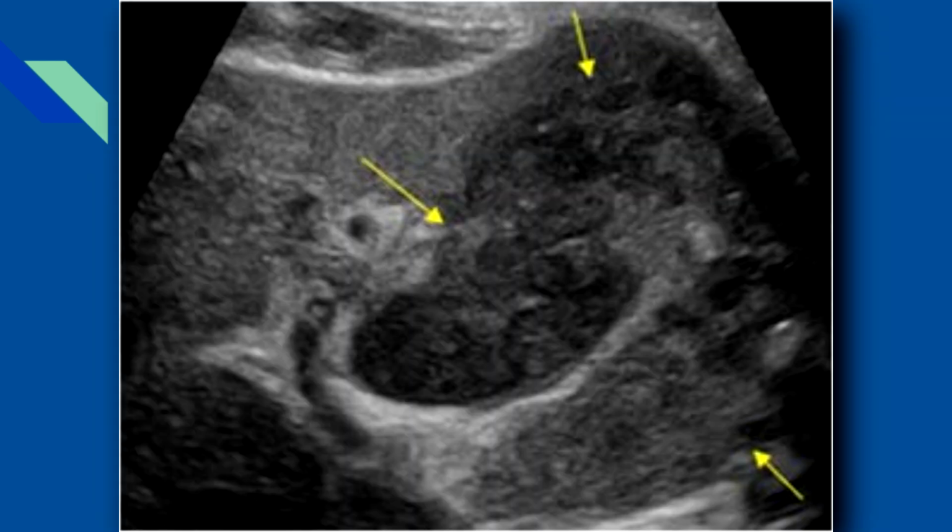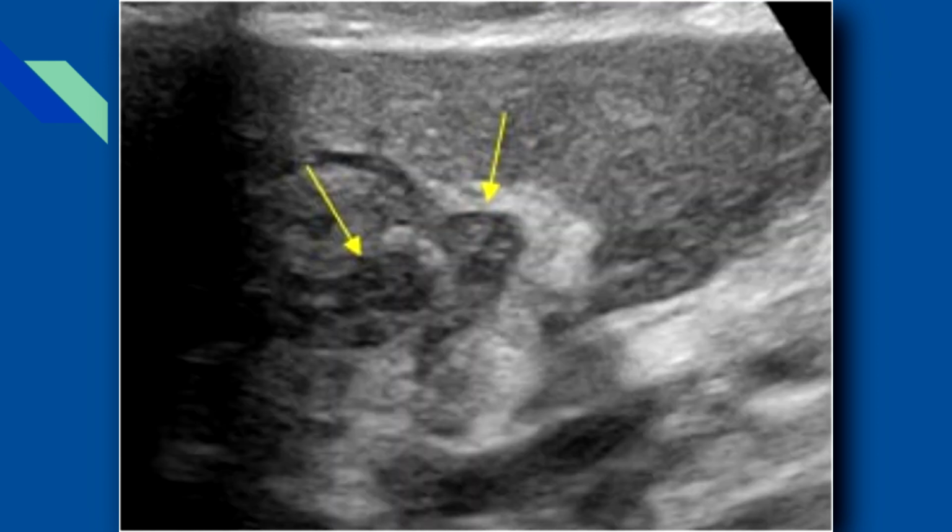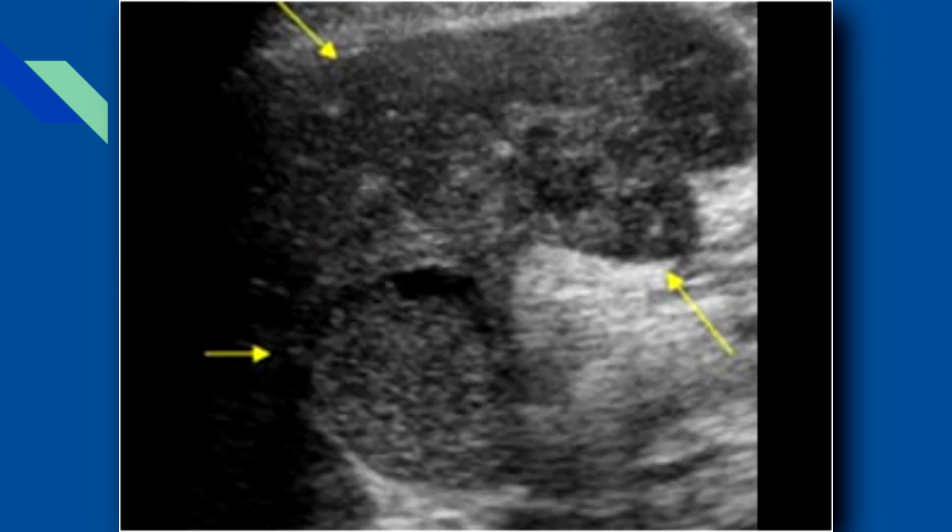There is increased risk in patients with gallstones and chronic cholecystitis. Sonographically, you'll see a mural lesion extending into the gallbladder lumen, maybe focal thickening or polypoid with a stalk. Color and spectral Doppler may show vascular flow within the mass and stalk. Gallbladder carcinoma is an aggressive cancer, and only 10% of patients present with early stage disease, and those patients are considered surgical candidates. The majority of patients present with advanced disease, with poor prognosis and high recurrence rates.